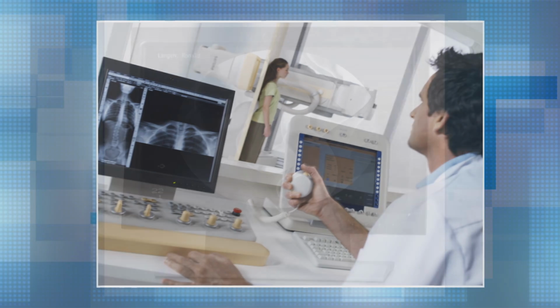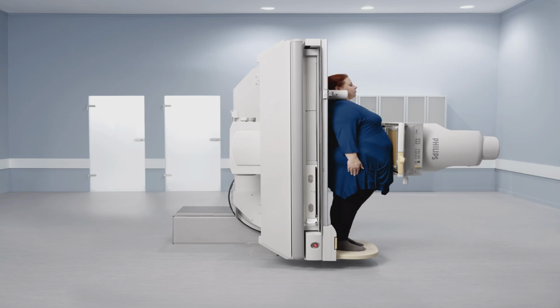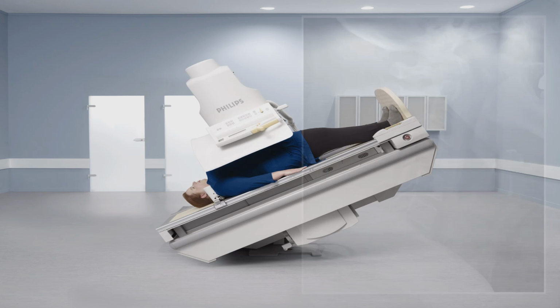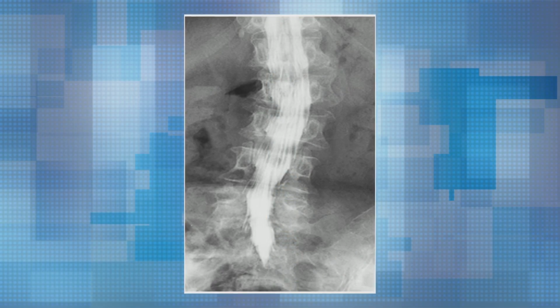The Easy Diagnost Aliva is specially designed for use with barium studies, and the bed can be adjusted or completely inverted to perform both oral and enema-type examinations, as well as myelograms, which are specifically designed to detect problems around the spinal cord.